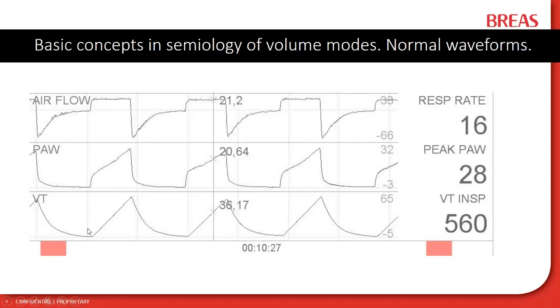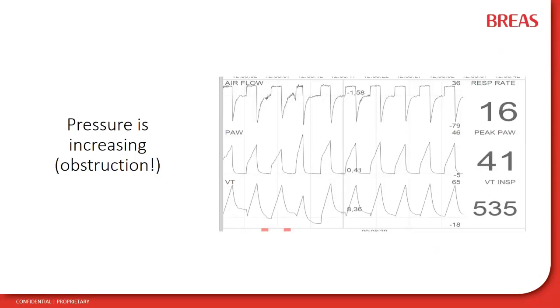As I've said before, we are working with volume, so our dependent variable would be the pressure. So our eyes should be directed towards the pressure at the first stage. And what can the pressure do? Pressure can increase or pressure can decrease.